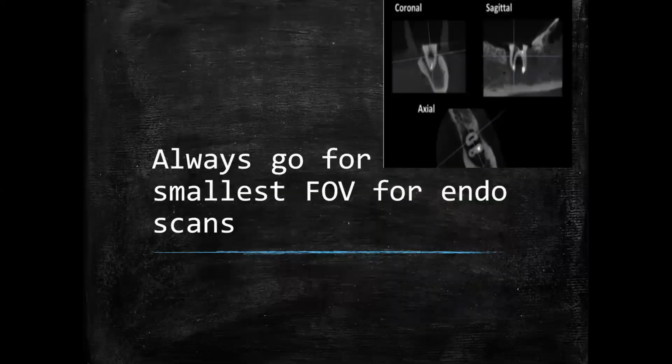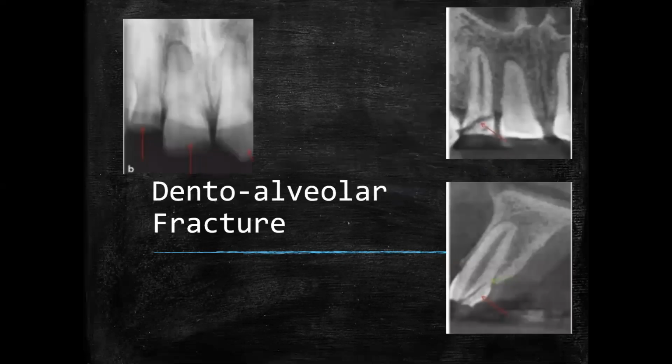Now, always remember that whenever you're going for an endodontic procedure, always go for the smallest FOV, because with the smallest FOV, the voxel size is less and you will get the best image output. Because in CBCT, there is a possibility of artifacts if there are restorations or any metal. So with the smallest FOV, it will be very good to give detailed images. Any kind of fractures which are present.